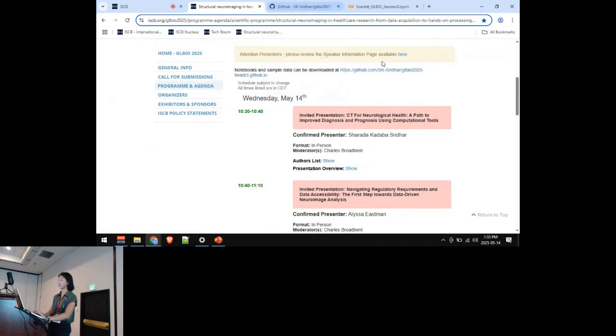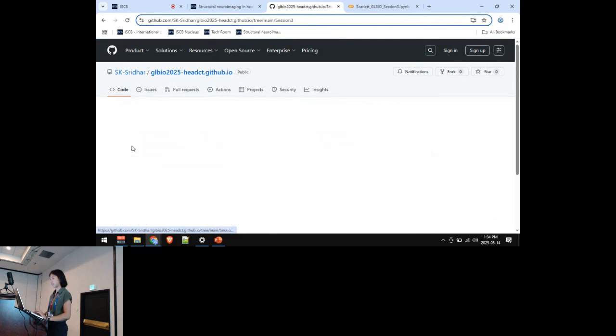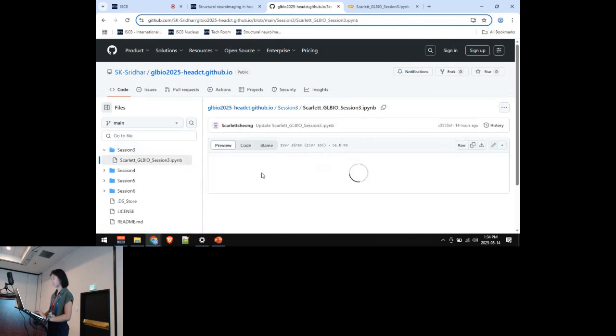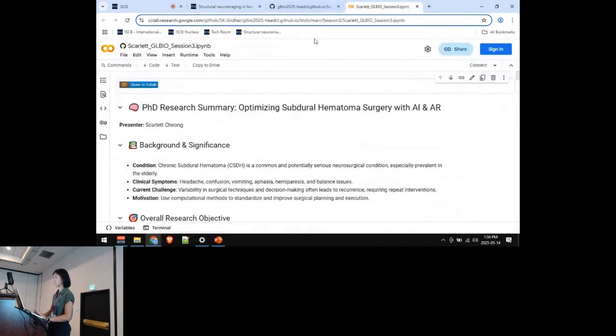So once you hit the link on the GitHub, you come to this page and you will see sessions 3, 4, 5, and 6. This will be for the rest of our evening here for the hands-on session. Right now I'm going to kick off with session 3. If you click into session 3, you'll see this session 3 notebook. You can click into it, and then you just say open in Colab. Click this button. It should bring you to this Google Colab right here.